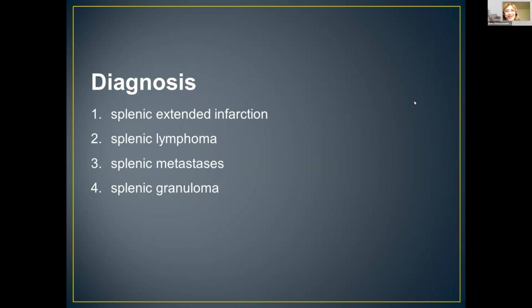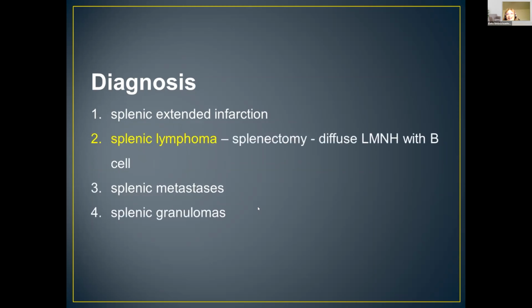Lymphoma. Yes. Splenectomy was performed, and diffuse non-Hodgkin lymphoma with B cell was revealed.